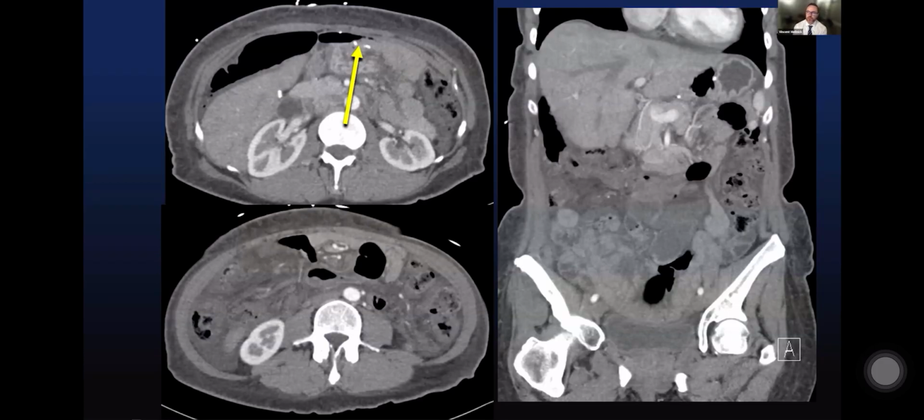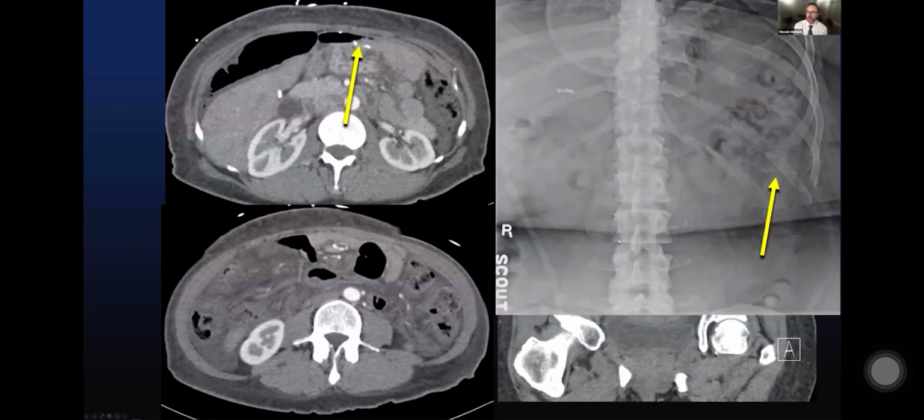This is a patient who presented with abdominal pain. You can see that he has some edematous small bowel mesentery with clumped bowel loops on one side of the abdomen. And then a really helpful feature is the fact that on this previous post-op leak check, his jejunal anastomosis is in the left mid-abdomen rather than in the central abdomen, as is the case here. And this is someone who has an internal hernia, not causing a mechanical bowel obstruction at this point. There's really not that much dilated small bowel. There is mesenteric edema, abnormal anatomic relationship, and this is someone who went to surgery right after this.